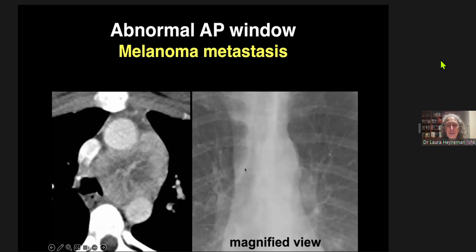So this very, very thin stripe that we see that forms the border of the trachea, the fact that we see that stripe separate from the line of the SVC means that the SVC and the trachea in this person don't touch one another. They're separated by something of a different density. So there's usually fat there.